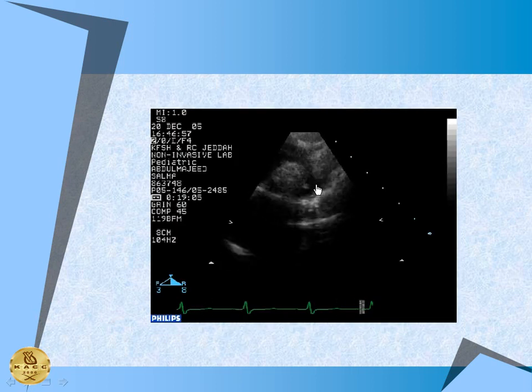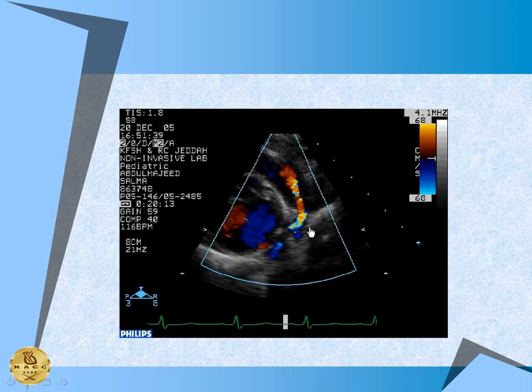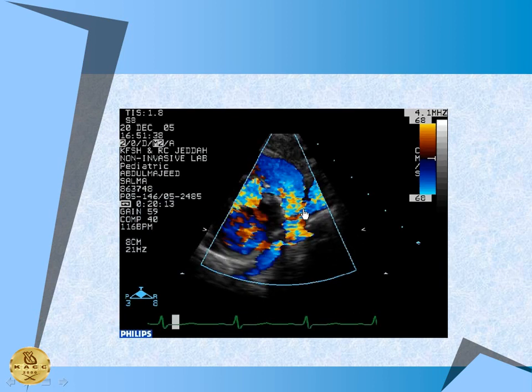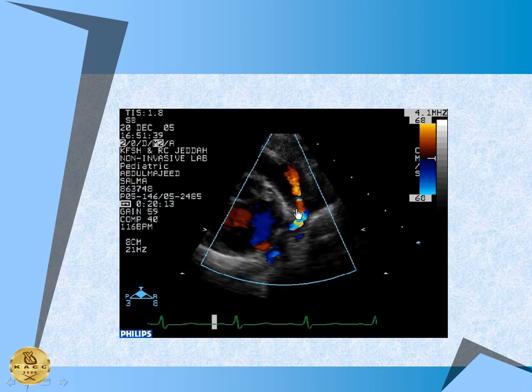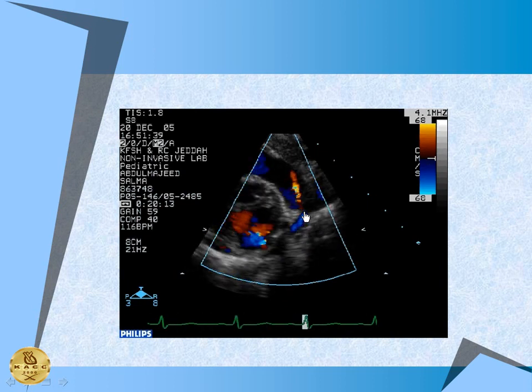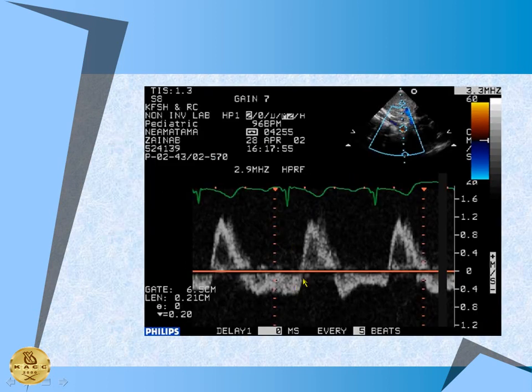This is again showing the displacement with arch hypoplasia. So this is where, if you repair, you may get an obstruction here. The surgeon may want to do it. Usually, if it's more than 3 millimeter by echo, we're okay in a neonate. And you see, this coarctation is very low again, and it is juxtaductal. And the ductus may close and pinch off completely, or may keep open. We don't know, and usually we observe these patients intra-hospital.